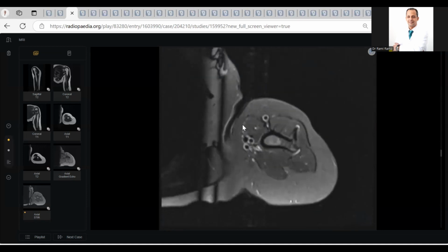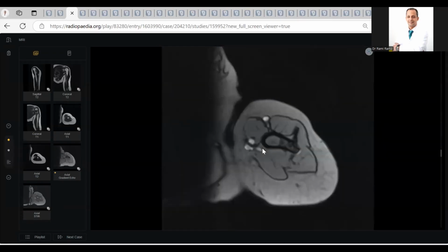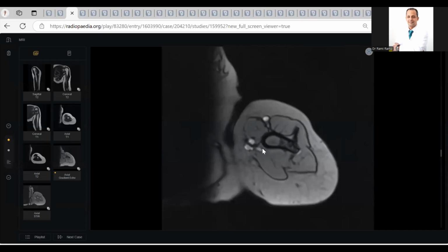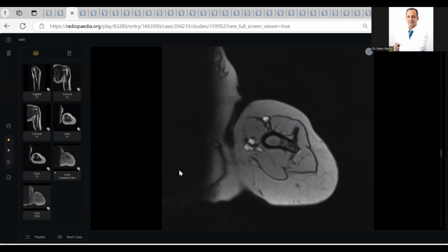Could you measure anything here? Sir, I would like to measure the cartilage thickness, sir, to see for any malignant transformation. What do you think, does the cartilage here favor the malignant transformation or not? Could you show T2 images?